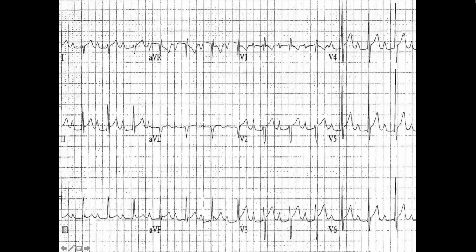Peek at this EKG. So first things first, what's our rhythm? Looks like a sinus rhythm, looks like a first degree AV block with a sinus rhythm. The PR interval looks a little long. What's my axis? Lead 1 is negative. AVF is positive. We have a right axis deviation. I'm thinking left posterior hemiblock.